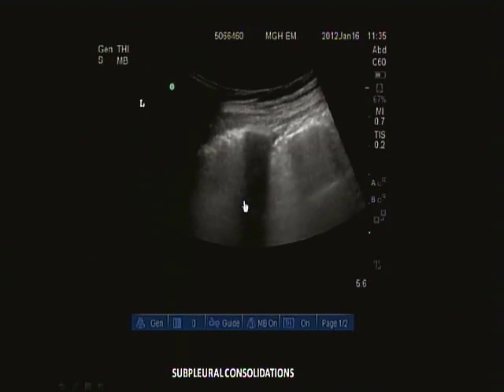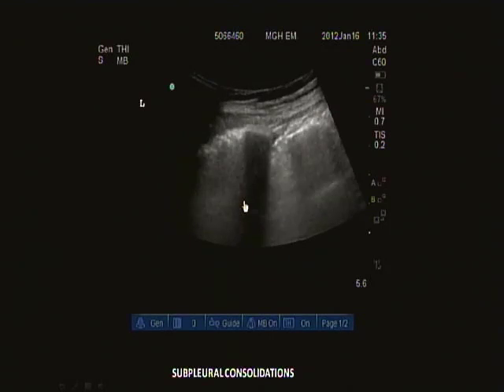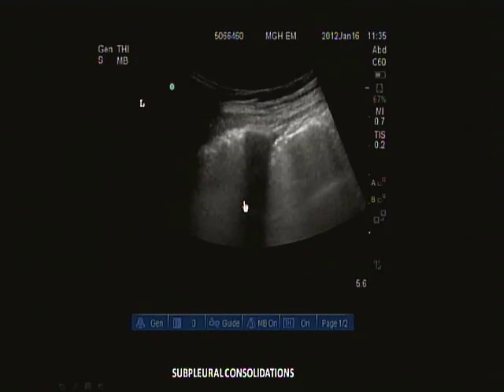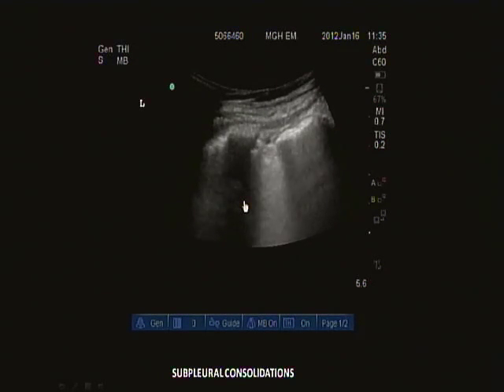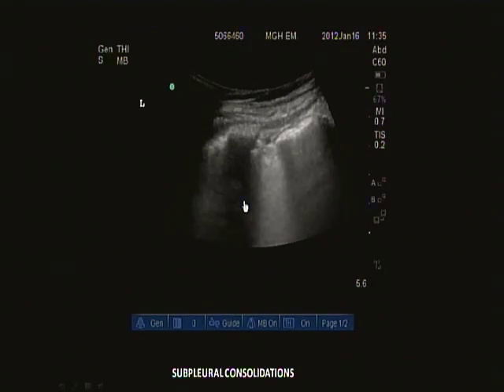A little bit about a few other lung ultrasound findings that I think are helpful also, because remember, not everything that is B lines is going to be CHF. We have pneumonia patients, we have bronchiolitis patients, we have ARDS patients. There are a few other things you can see, especially if you start doing more lung ultrasound, and that will start to help you differentiate these patients.